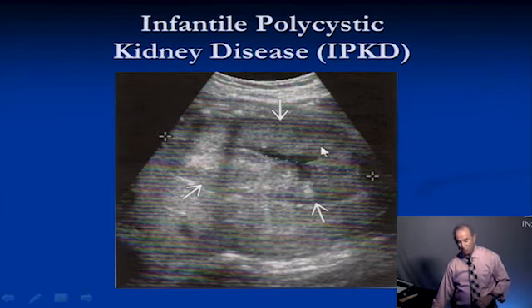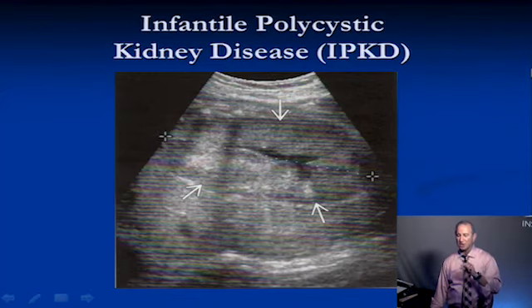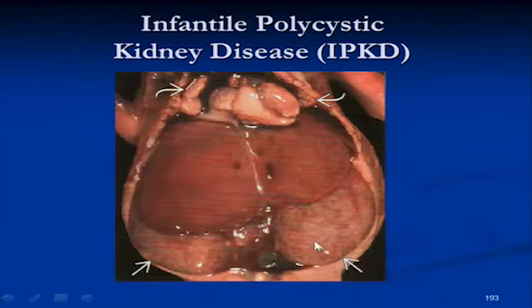So those kidneys, we said this, have multiple cysts, numerous, thousands of them, but they're all small, 1 to 2 millimeter cysts. So how is the kidney going to look? Echogenic, white, and also large. So a large echogenic kidney is polycystic kidney.